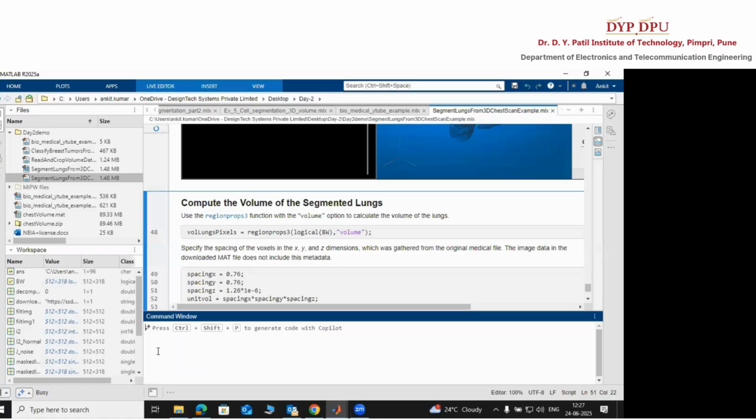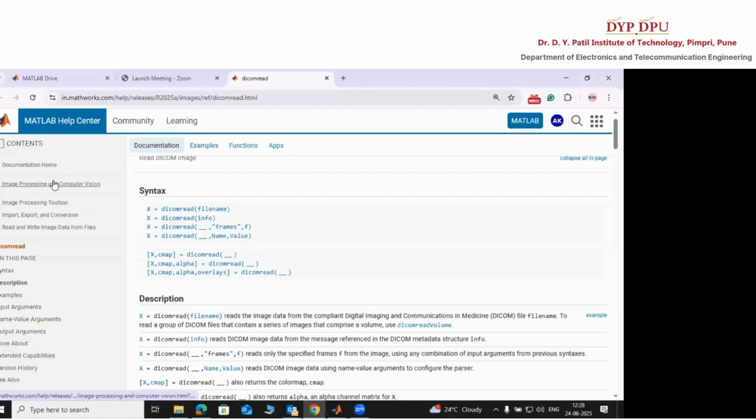Or simply pass the command. Sorry. Proceed. Code is running. Come here, I have already passed that command.